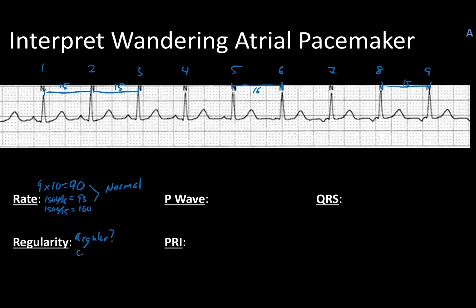I don't really have a pattern. I don't have any true ectopic beats, but my P waves look pretty weird. So let's go through here. If I compare each and every one of my P waves, I will note that the first 4 are about the same, then it gets tiny, then we're inverted, worse and worse. So those actually have a whole bunch of different shapes to them, really. So I have many types of P waves, but I do have one for every QRS.